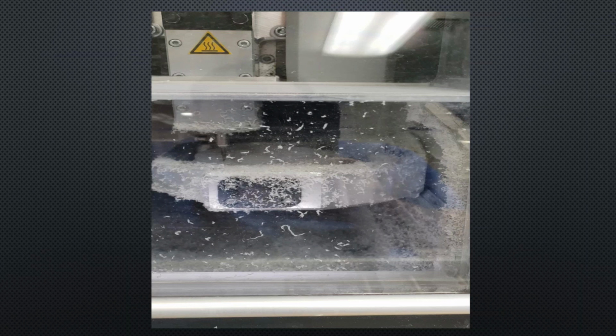But that being said, my experience is what my experience is, and that's all it had. So be careful. Definitely monitor. This is a VHF mill that I'm using here, and I have had zero issues. Just so you know, the VisiClear has recently come out, but I've been milling it for about 1.5 years now, and I have a pile of used pucks.